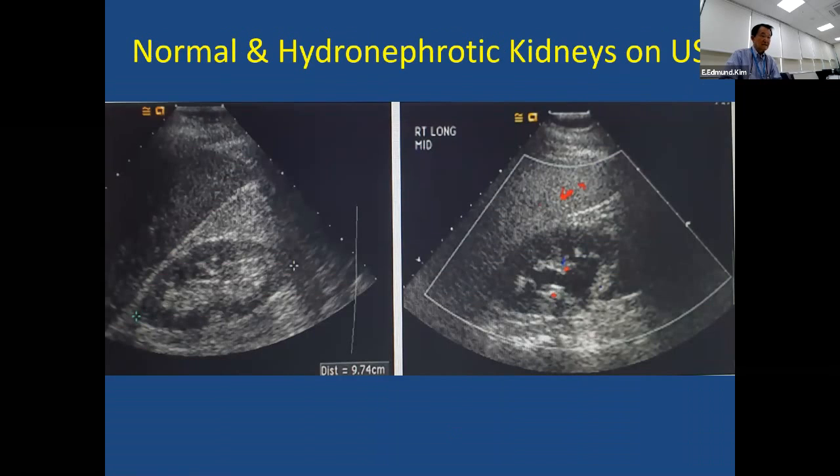And so, see the cortex here, this is a medulla, but here you see some echo-free area, that's a dilatation of the collecting system.